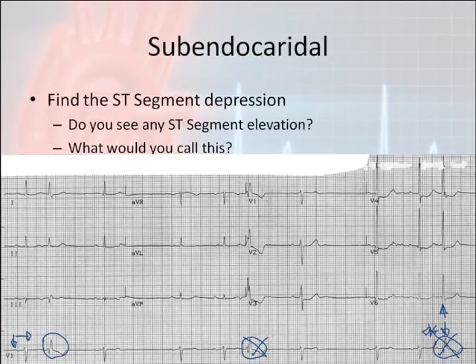So if I cross out all of these complexes here, that means I have to cross out all the complexes above it, because this is not actually telling me anything about my ischemia or infarction. It will tell me what's going on with my rhythm. It may even tell me what's going on with my bundle branch blocks, but I cannot use those complexes to determine ischemia.